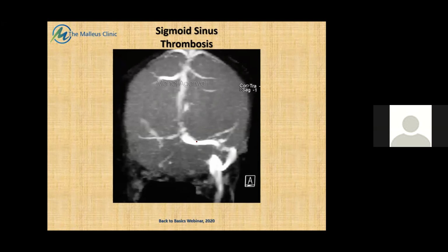So lateral sinus left side intact, transverse sinus right side involved. No visualization at all of the lateral sinus on the right side. I beg your pardon.